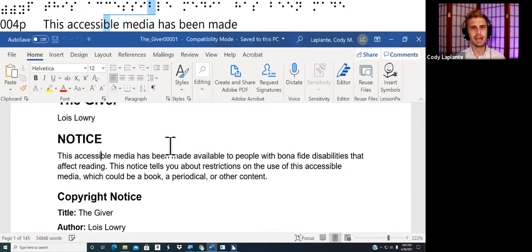So you might ask yourself, why is a Braille display so awesome? Well, it's because you can get something that is totally not in Braille, something that is just a Word file, just random. And now it can be in total accessible Braille for you. That is why Braille displays are so awesome. Now you might be saying, oh, my BrailleNote Touch can do that as well.